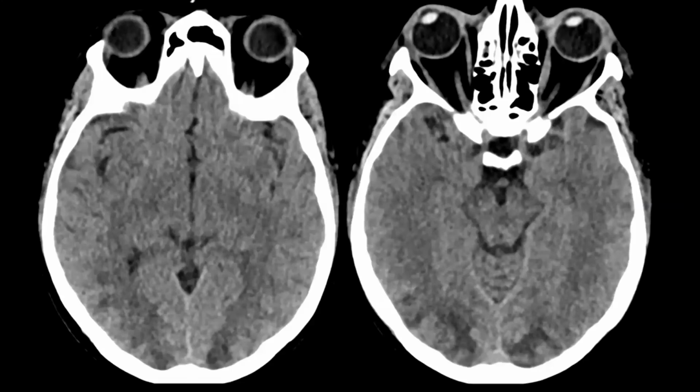Last case, this is a woman who developed seizures shortly after giving birth. And what do we see? We see hypodense changes in both occipital lobes. The cortex is spared. They are located in the subcortical white matter. You could say, could these be bioccipital infarctions? But then it is strange that the cortex is not involved.